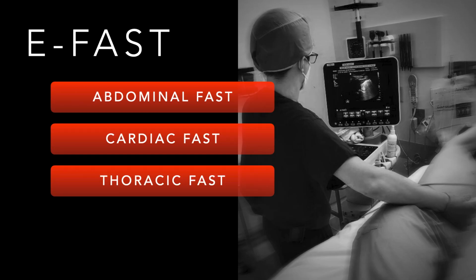We talked a little bit last week, just as a recap, about the abdominal and the cardiac FAST, what you're looking for in those settings. We looked at some normals, we looked at some abnormals, and then today we rounded it out with the thoracic FAST, looking at the use of ultrasound to evaluate for hemothorax, looking for pneumothorax, see if there's anything that we can identify there and how to interpret that in the clinical context.